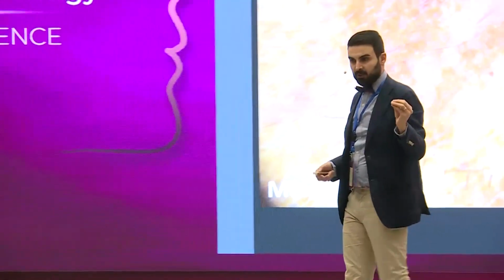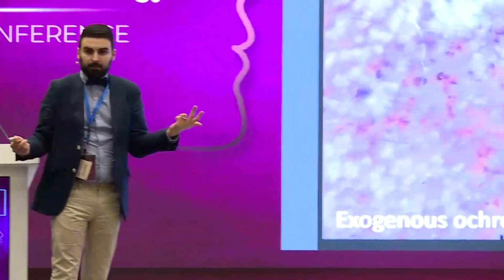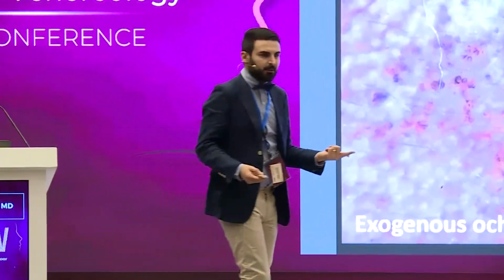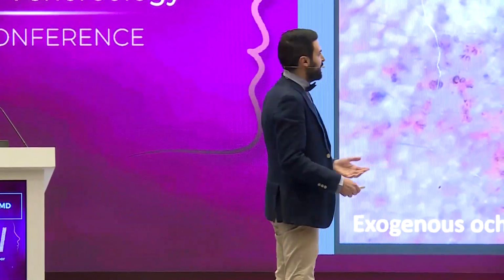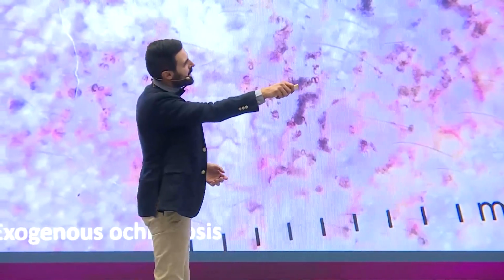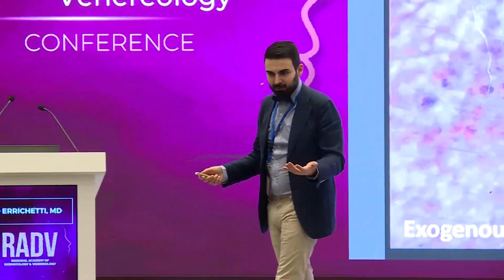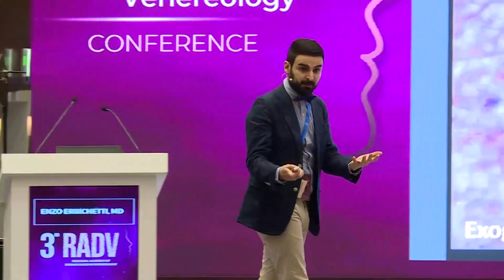We don't see the eccrine ostia pigmentation in melasma. And then the third group, which includes just one condition, exogenous ochronosis, which is typified by these very nice circles and semicircles, which corresponds on histology to the banana-like shaped bodies, so these thick collagenic fibers covered by ochronotic pigment.